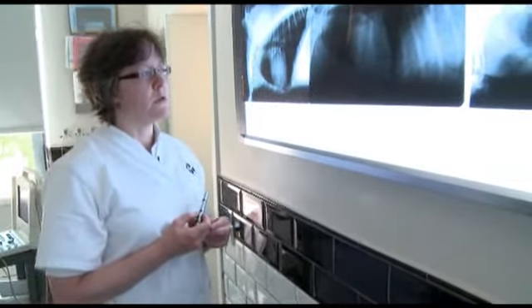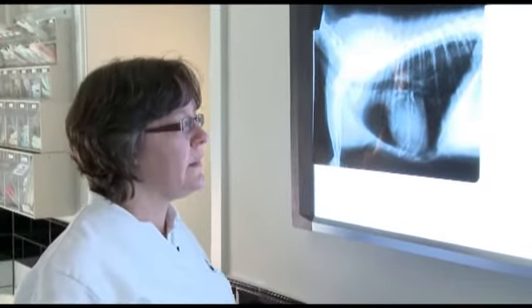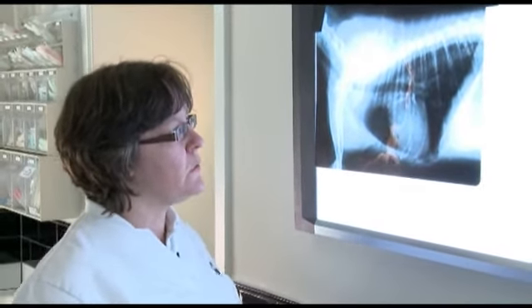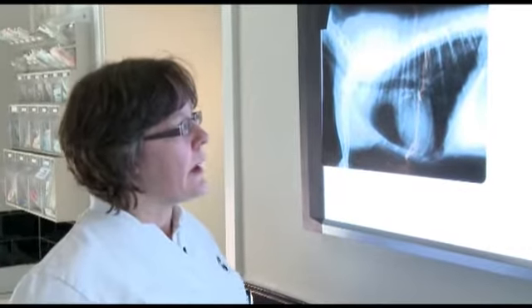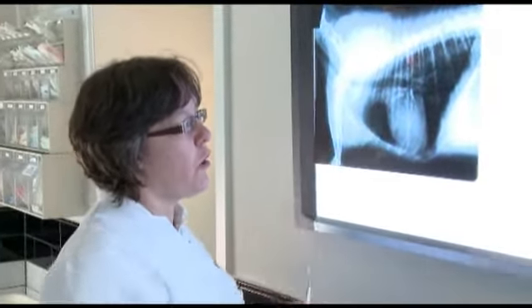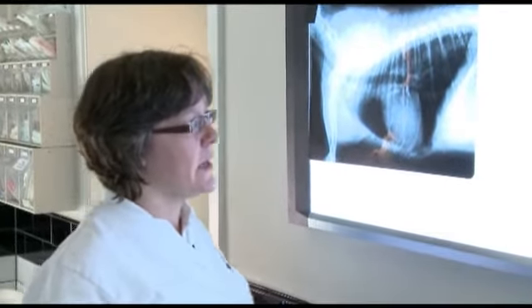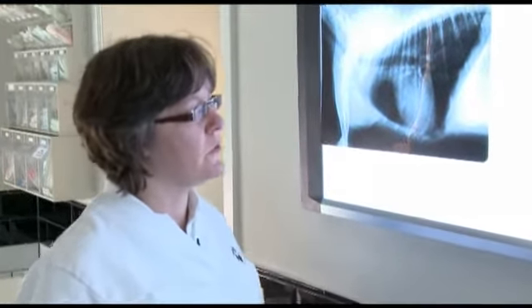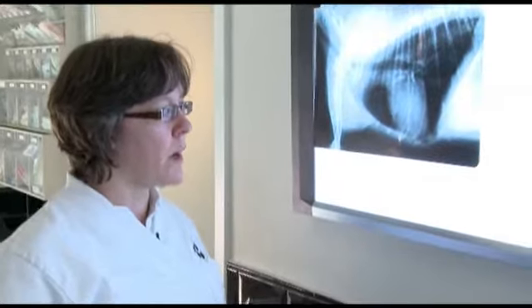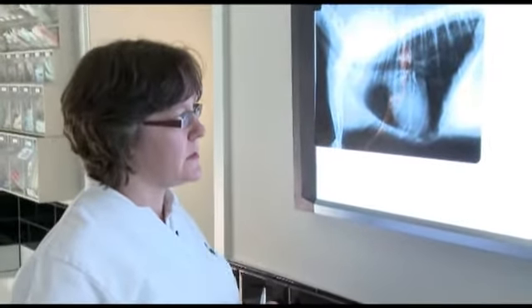So it's very important, before deciding on the presence of an interstitial pattern, that we are absolutely sure that the radiograph is end-inspiratory. A pulmonary bronchial pattern is characterized by thickening of the smaller airways, which is visible on thoracic radiographs by little donut signs or tram lines. Occasionally we can even see dilation of the larger airways, which is called bronchiectasis. It indicates, in most cases, bronchial disease like chronic bronchitis, eosinophilic infiltrates of the bronchi and the pulmonary parenchyma, and many other respiratory diseases. It is not characteristic for heart disease.